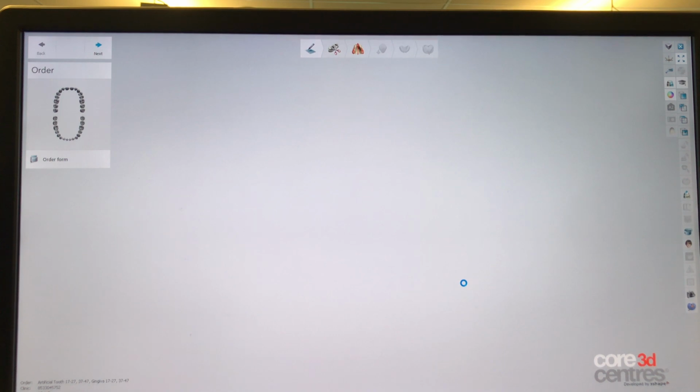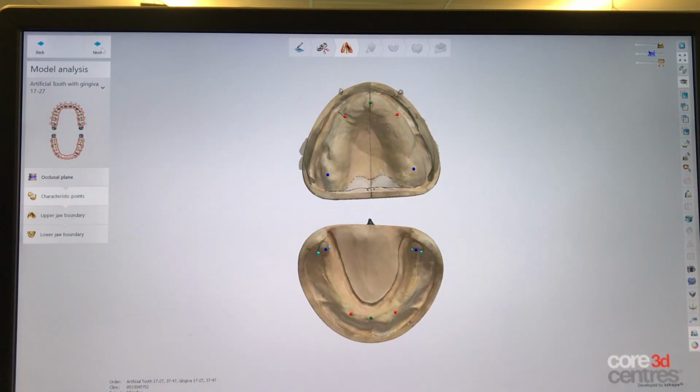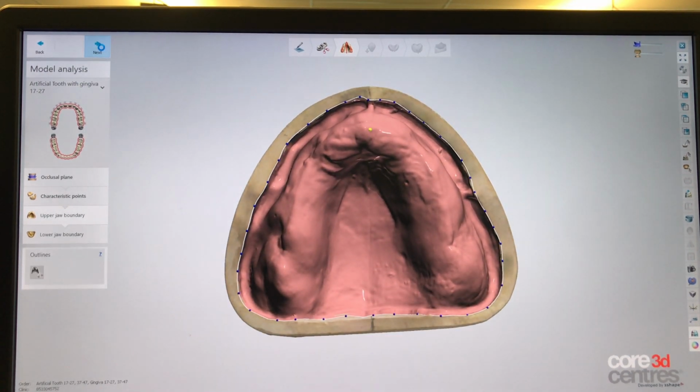So once we generate a file, it's there until we delete it. There's our file. We already did this, remember? Points of interest. We did our spline.